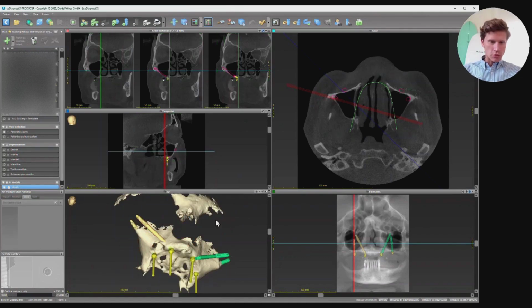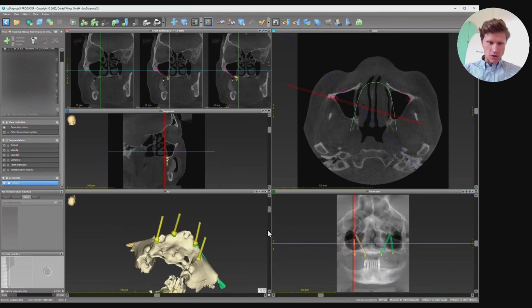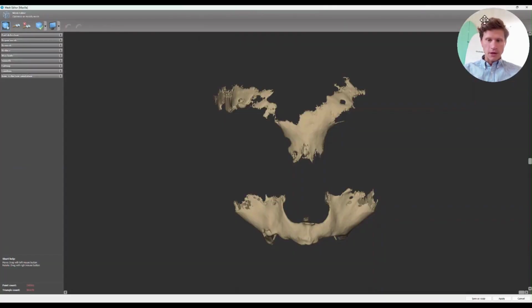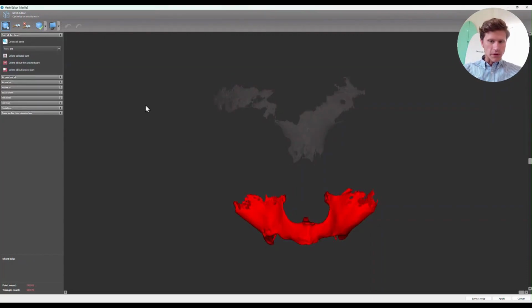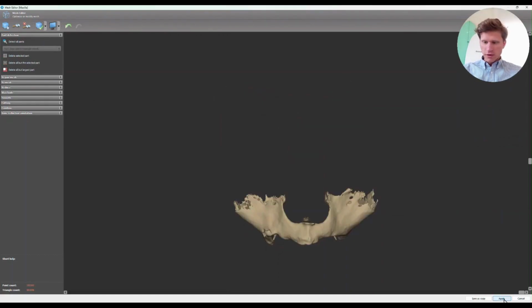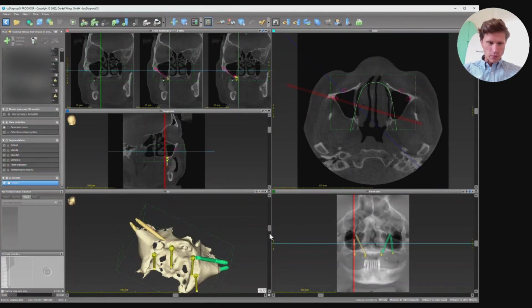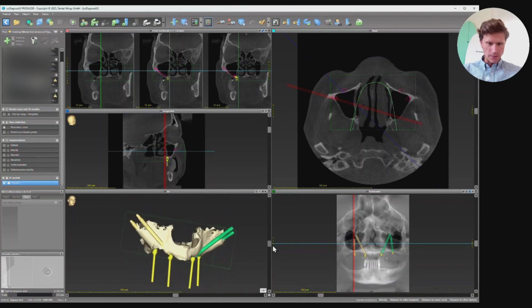There is no segmentation. What we have here are the AI models. As I told you, this is too much, but how can we adjust it? Just click with the right mouse button and click Edit Mesh. And right now I can click on Part Detection. Detect all parts, and now I can see selected parts, and I delete all parts but keep selected. Then I click on Apply. So now my AI model is modified.